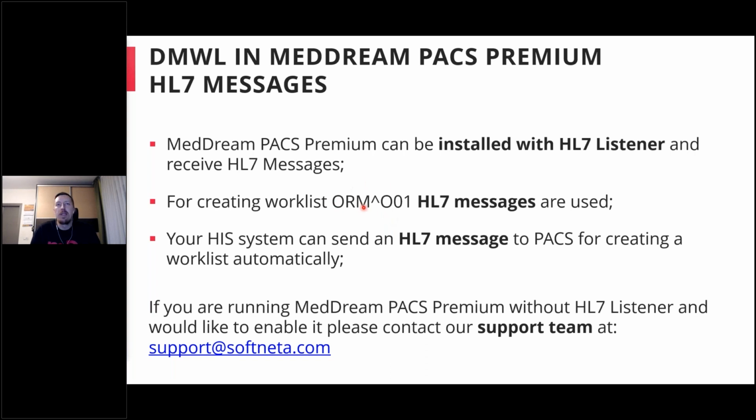But the ORM messages are used for creating the worklist, and these messages can be sent to the PACS Premium HL7 listener. As I mentioned before, usually your HIS system would send these messages to the HL7 listener, and the worklist will be created automatically. If you already have PACS Premium running and you installed it without the HL7 listener and you want to enable it, to try it, please contact our support team.